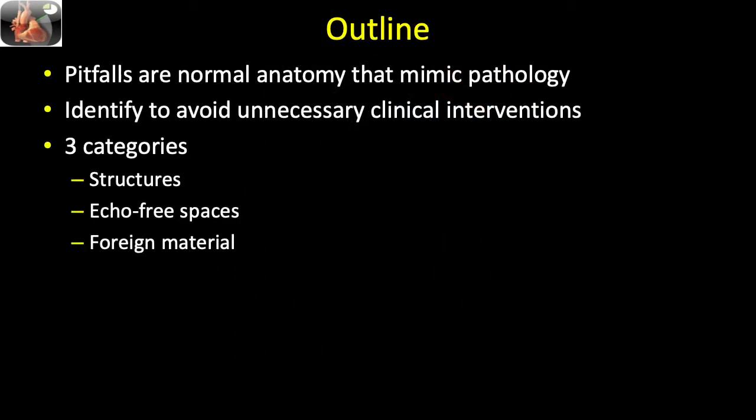Pitfalls are errors in interpretation of normal structures mimicking pathological entities, which may result in unnecessary clinical interventions. Pitfalls generally fall into three categories: structures, echo-free spaces, and foreign material. TEE shows many remnant structures from embryological development.